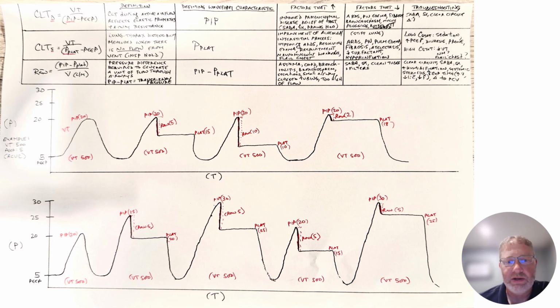So here we've got a decrease in the plat from 15 to 10. So the static compliance increased. The dynamic compliance did not change. The resistance increased.